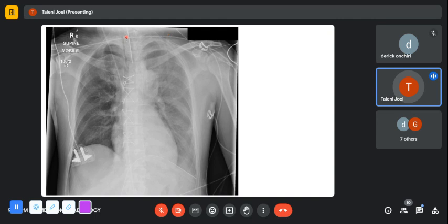All right. So, for instance, this is an AP radiograph in the supine position of a patient who is very unwell. We can see that they are intubated, and what we see is that on the right hemithorax, we have this hyperlucency extending deep into the costophrenic recess. We have this extension of air, of hyperlucency, and then the cardiac border is also well outlined by air.